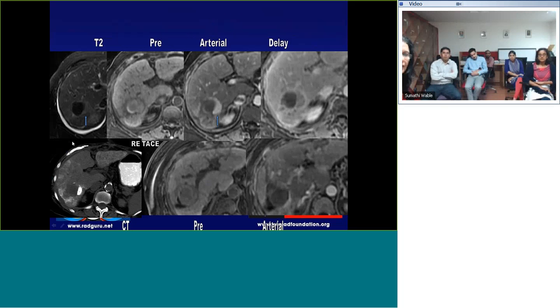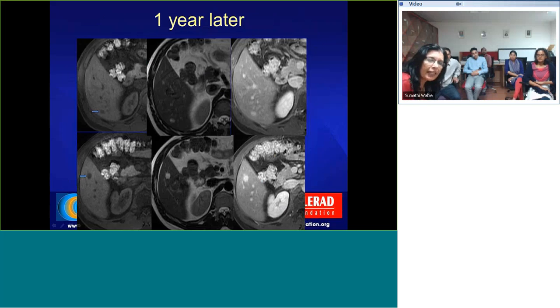Now, what if it is partially treated? All of this happens. These are all cases we actually solved. And so this was a post-TACE, and they TACE them multiple times. So it can get very hairy sometimes. And many of these patients have more than one lesion. So this can be very time consuming sometimes. So T2, again, you don't want to see, I don't know if it projects.